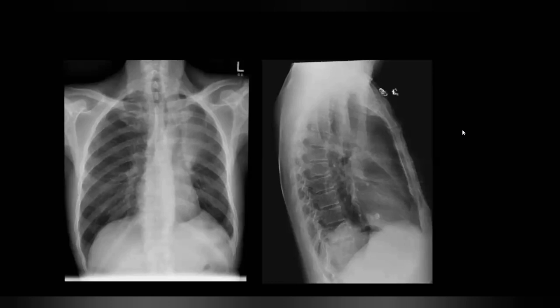So to complete your description, now you have to tell me what are the causes of lobar collapse. Okay, so it is secondary. What are your main concerns? As it is a skeletally mature patient, I would like to know the age. Maybe it could be 50. It could be secondary to a mass present in the region of the bronchus, which is obstructing it and leading to this lobar collapse.